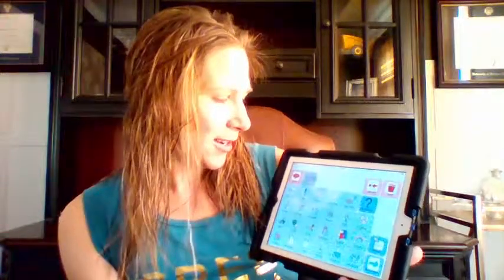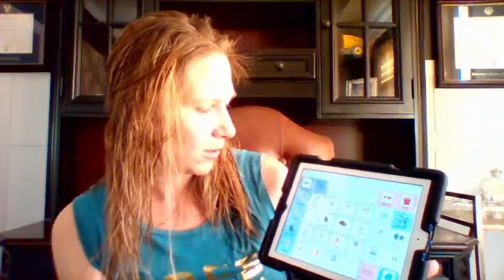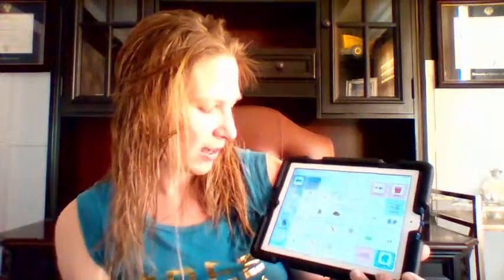I was also looking for the word help, and I just found it this morning. I needed it for one of my other videos, and I went into the help category, which is where you would think you would find just the word help. But despite that, I couldn't find the single word help. It is a very robust vocab set here. So help has I am hungry, it is broken, I feel sick, my shoes hurt, I need the toilet, I need to blow my nose kind of thing, I'm uncomfortable. Even though I couldn't find the word help, it has a very robust set in that category.